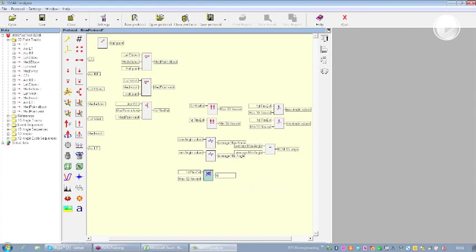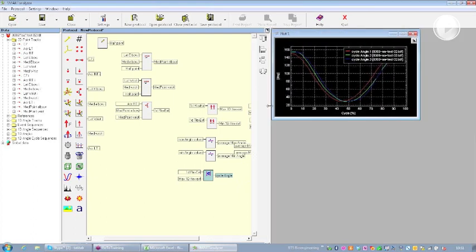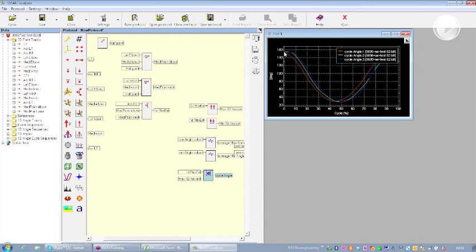So this is going to be my cycle angle, and this is the sequence from the extended position, flexion, extension again. And we can see that we did it 3 times. So it is okay according to what we saw in the reconstruction.